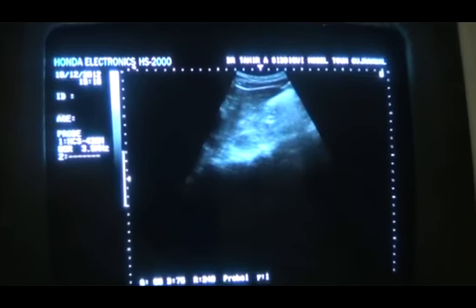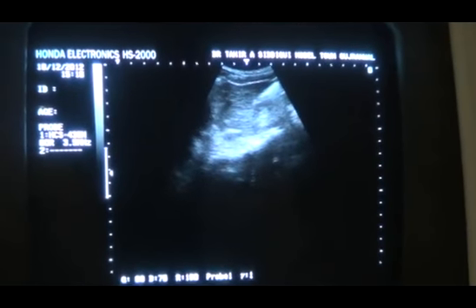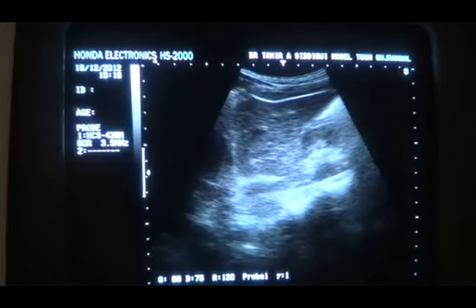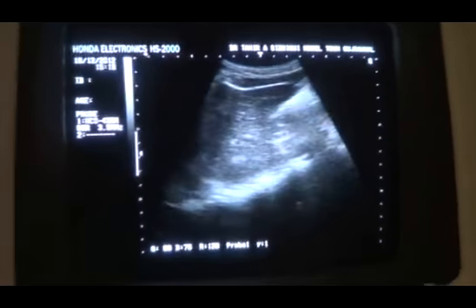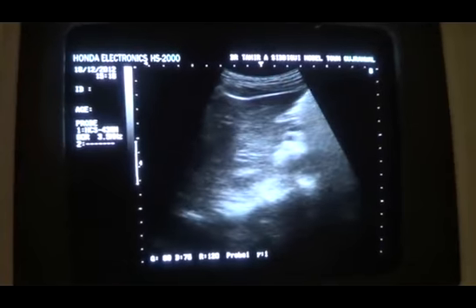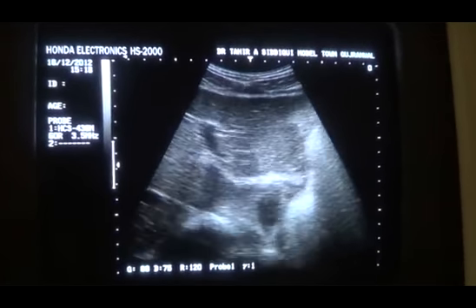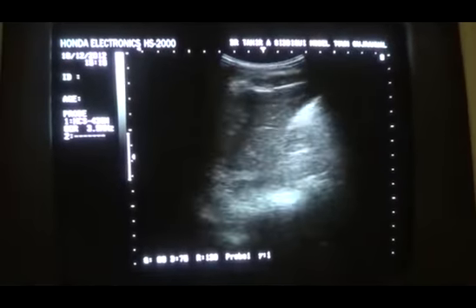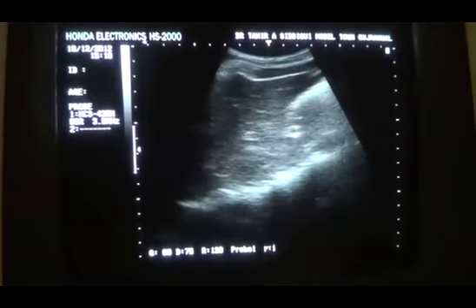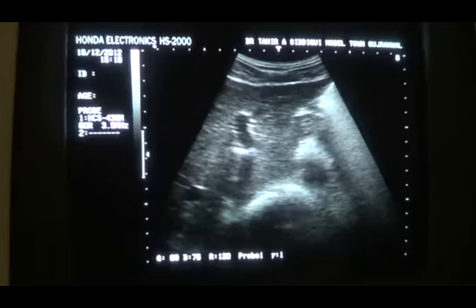Now this video segment is regarding the echogenicity of the liver parenchyma, whether it is normal or not normal. First we will consider this fact. I am going to inform you that this is a normal liver parenchyma by all parameters.